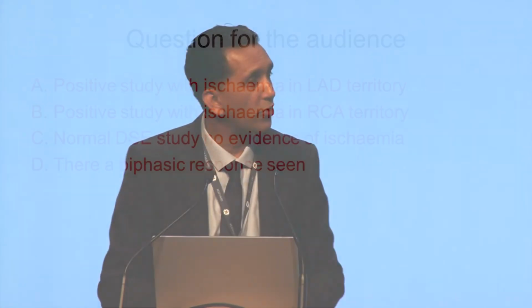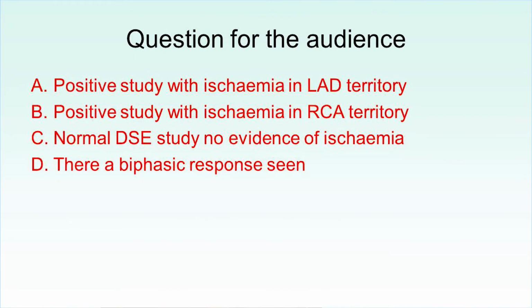So this part is going to drop off to the questions for the audience. Positive study, ischemia in LAD territory; positive study, ischemia in RCA territory; normal DSE study, no evidence of ischemia. There's a biphasic response.